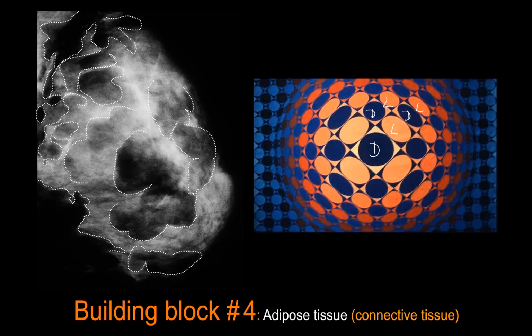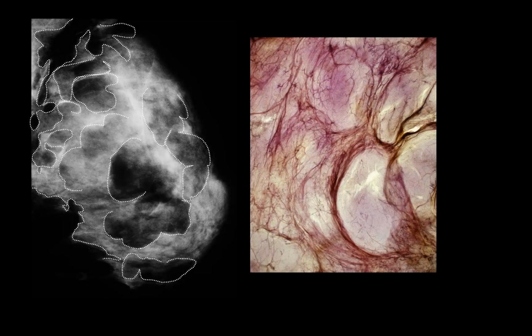Well, this is a mammogram. This is a three-dimensional organ. Dark and light, and dark and light, and dark and light. So try to recreate in your mind the three-dimensional picture. And you do it by doodling, as I'm doing. You doodle for a while, and after that it becomes your second nature.